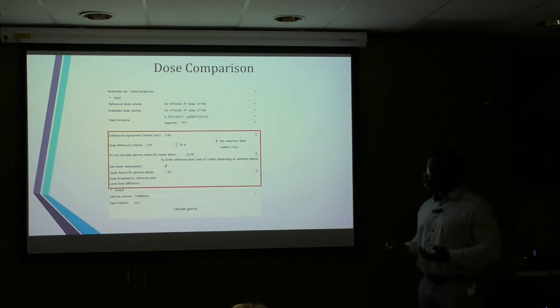And it has an input to allow for quicker computation. This particular input will assign whatever value you put here to gamma values that are greater than this value. So if you want the computation to be faster, you would set this to a relatively low number. 2 or 3 is generally what is recommended. So in this case, any gamma value greater than 1 will be assigned a value of 1. So this will help speed up the computation.